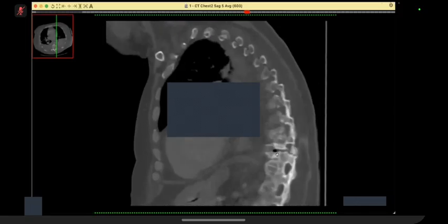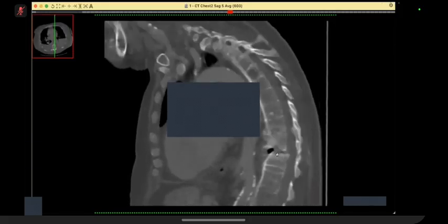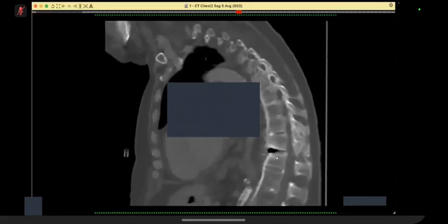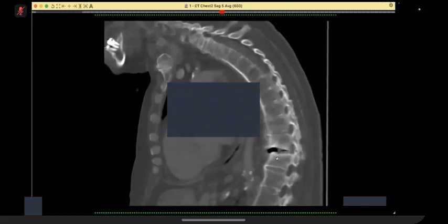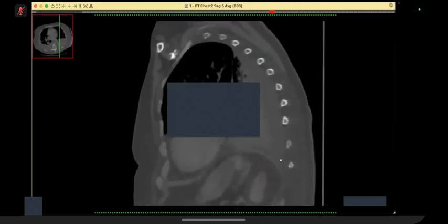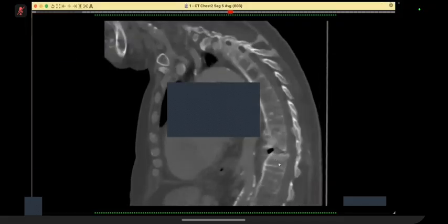I would like to see if the alignment of that vertebra is normal. In a case of ankylosing spondylitis, such a vacuum phenomena could be a carrot stick fracture of the spine, which could correlate with the symptoms of the patient. So this is an urgent finding, and I would like to inform the referring... Is there a fracture? Okay, I would take that statement back. This could just be a vacuum phenomenon within the intervertebral disc.